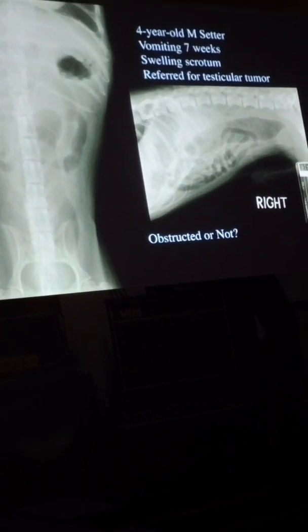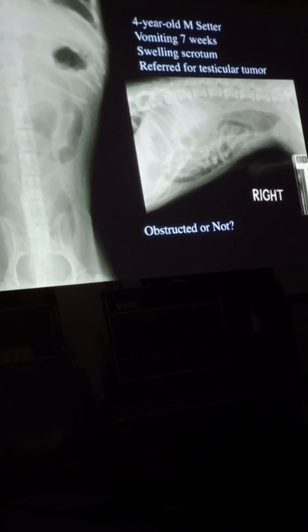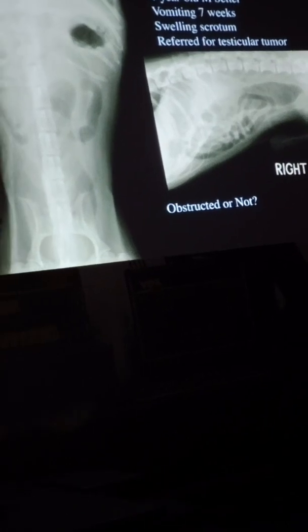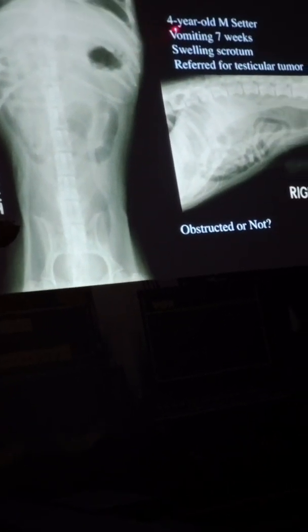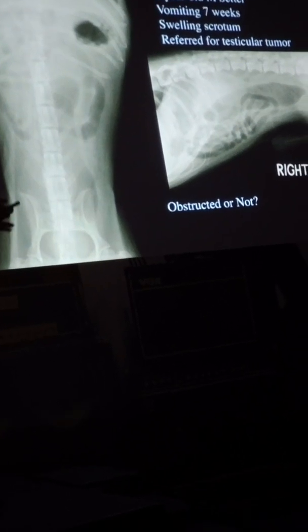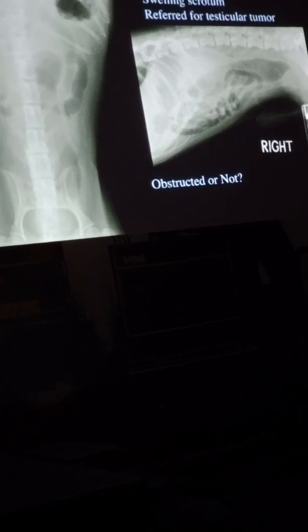It's hard because I don't have a lot of the caudal abdomen on there, so the prostate may be big. But remember, prostatomegaly can be just a 4-year-old dog that's intact, right? BPH, benign prostatic hyperplasia, some people think it's almost a normal finding.